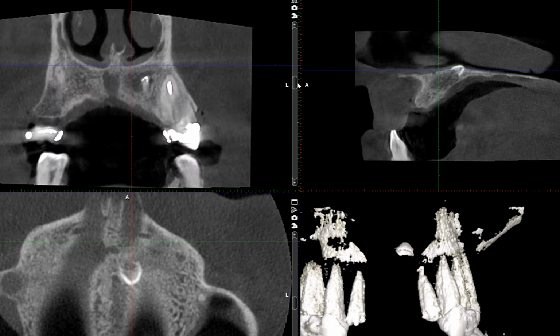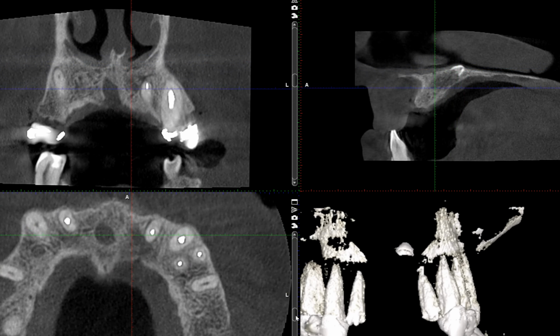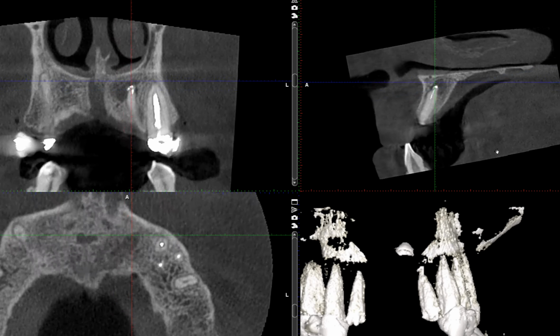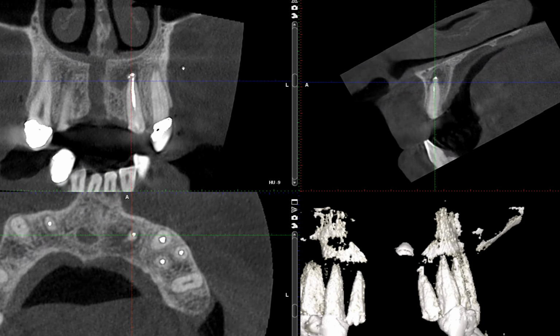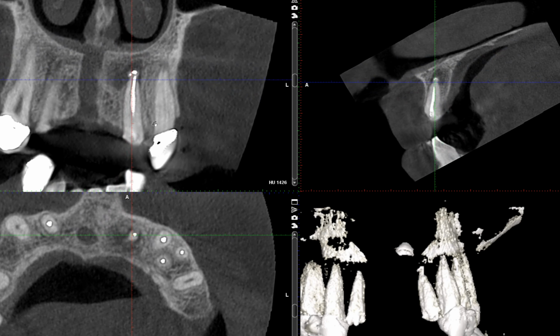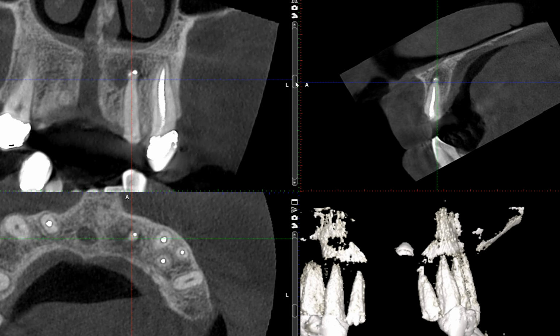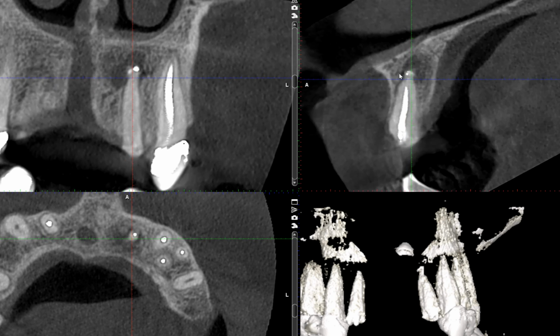Furthermore, I know that number, was it 10? Yes, 10 was missing its crown with periapical radiolucency, and that can be seen here as well. So let me rotate my view so that we're looking at number 10, and there it is. It's missing its crown, and there's a clearly periapical radiolucency involving this tooth. Right? So there's a periapical radiolucency.